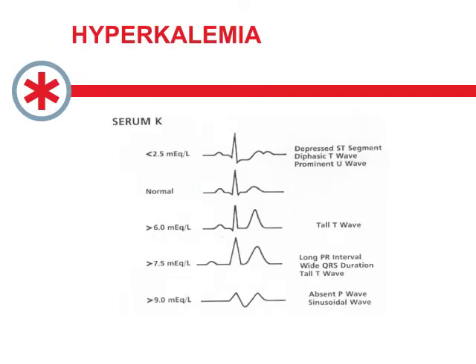So the numbers on this are not necessarily always correct or correlative, but basically as your potassium rises, you start to get these tall and peaked T waves. As it continues, your PR starts to stretch out, your QRS starts to widen a bit, and if it keeps going, you lose your P wave and you get this sinusoidal complex that we're so commonly worried about. So recognition of hyper K is just one of those things we've got to own.